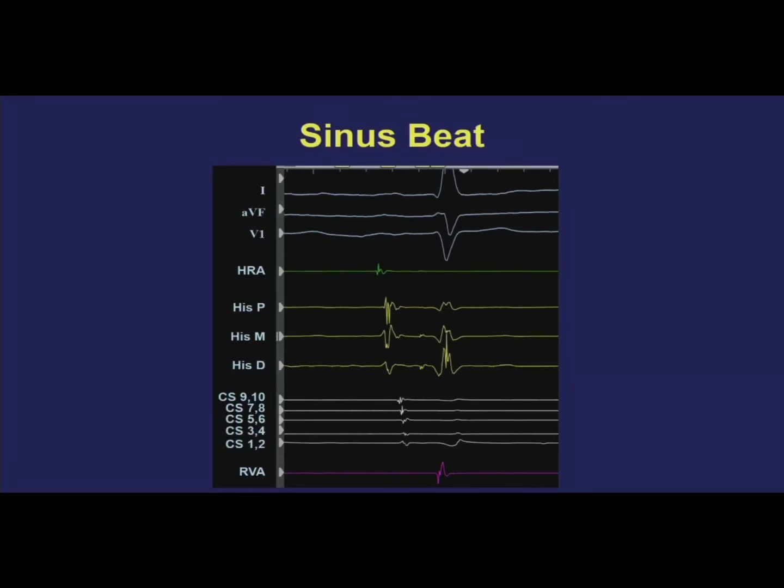But you want to measure to the first ventricular event, which is usually the very onset of the surface QRS, which really does summate all of the ventricular myocardium, not just the little local areas where our bipoles are sampling. Yeah, it's a common mistake and assumes particular importance when you're looking at VA times. You always measure it from the first ventricular activity on the surface or intracardiac. It's almost always on the surface.